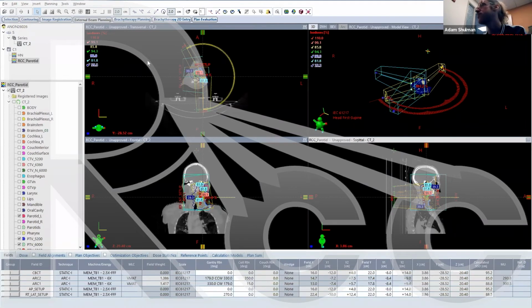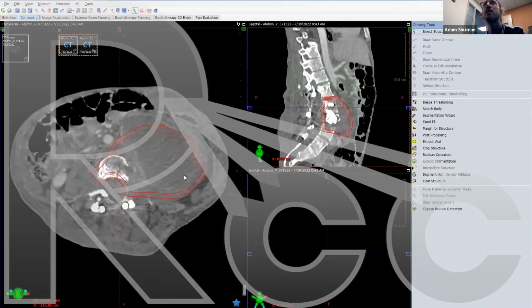And the max doses within our Z PTV Opti Max are usually on the order of 8% for a max dose, depending on how complicated it is. This case was, again, quite complicated. It's a big tumor. Those big tumors are actually tough to optimize. I think we had a max dose of 13%.